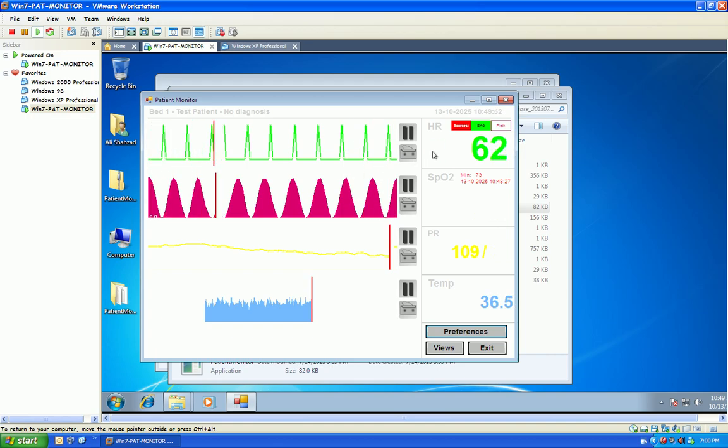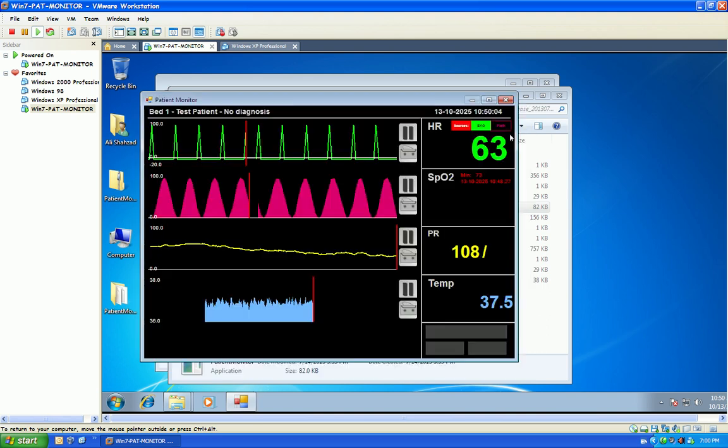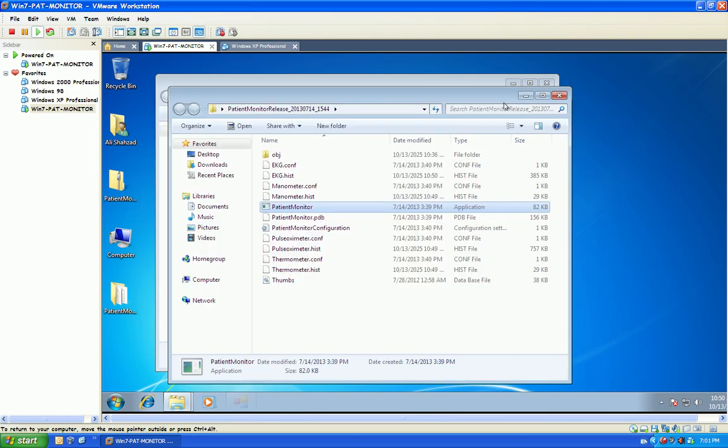Now the green and the pink one are flashing, blinking all together. And if we go back to the black one, we can click and continue, and we can go back. And that's how the simulator works.